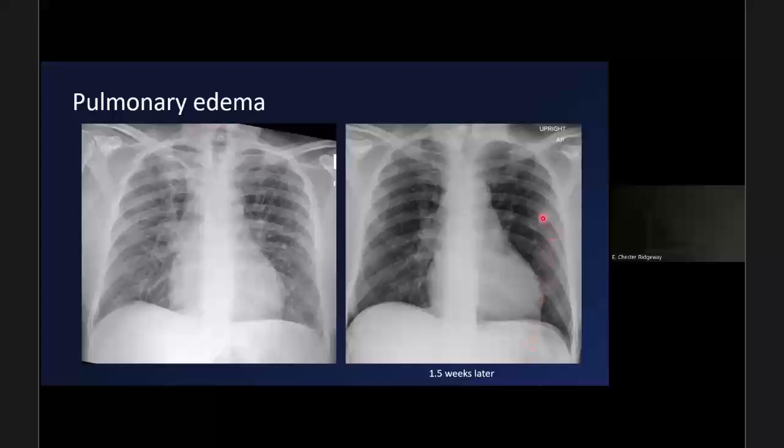Just notice that you can still see vasculature in the lung parenchyma. It's just not as florid as when someone has edema. So this is a more advanced concept when you're starting to decipher between mild edema and normal. Again, just give your friendly radiologist a call and we can help you out.